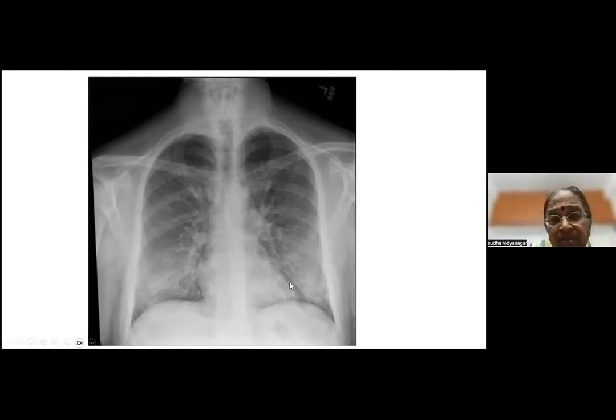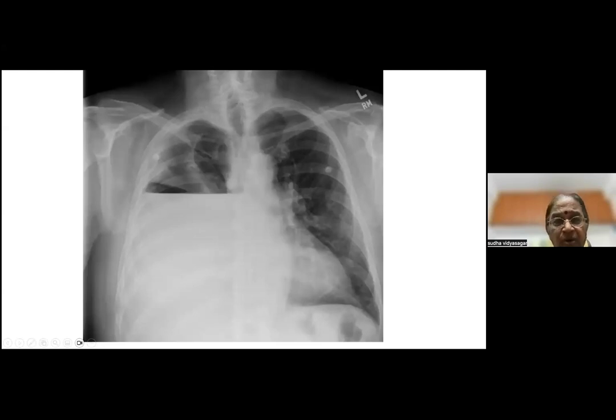There's a pneumomediastinum. Can you make out that? There's a pneumomediastinum nicely there. Usually occurs in the context when you have a tracheostomy or some pneumothorax, something like that. Or you can get a spontaneous one. We even, I think, published a case of spontaneous pneumomediastinum in a person with asthma. So it can come. There may be some shadows here which are looking like a pneumonitis, but there's a nice pneumomediastinum on both sides, right? Let's go on. Next one.